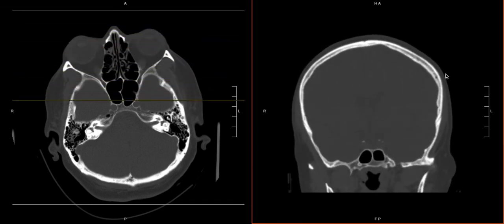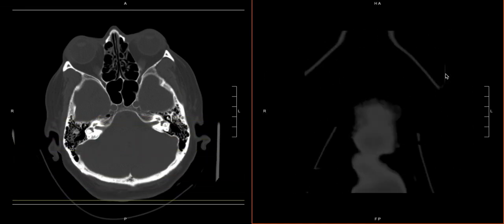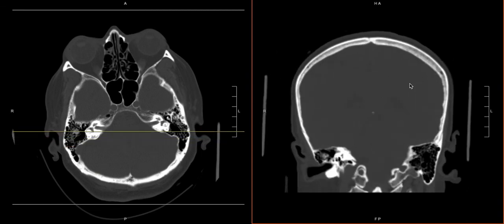And at that point, I know that's a lot, but as you do it, you'll get more comfortable going through your search pattern. At that point, you've done a pretty good job of looking at all of the bones and all of the orientations, and you're ready to move on to the other parts of your search pattern.